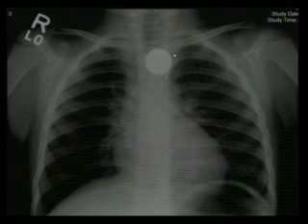Here, this is most likely going to be a coin, but it could be a battery. You've got to realize a lot of people think it's as big as a quarter, but a lot of times these are just pennies because there's magnification. So you really can't tell what coin this is. But here we know this is not in the trachea because here's the tracheal air column. If it was in the trachea, it would have been in the trachea, but this is outside the trachea.